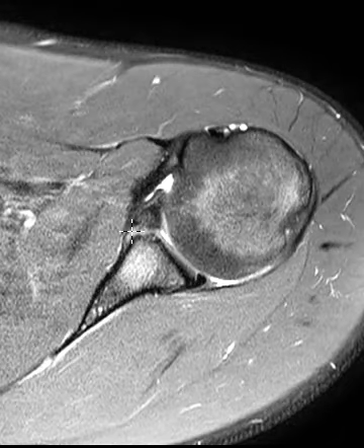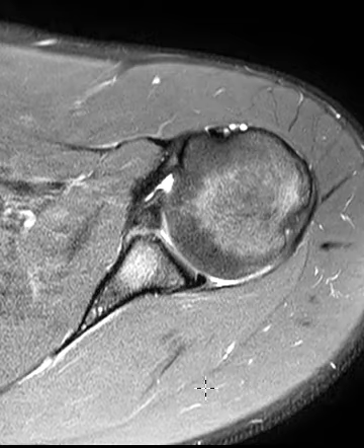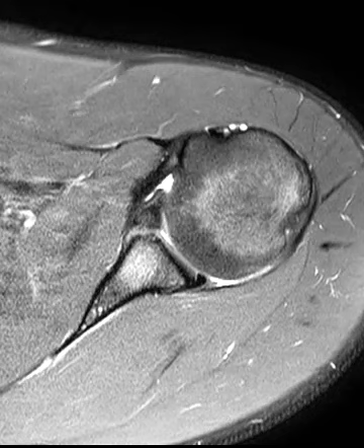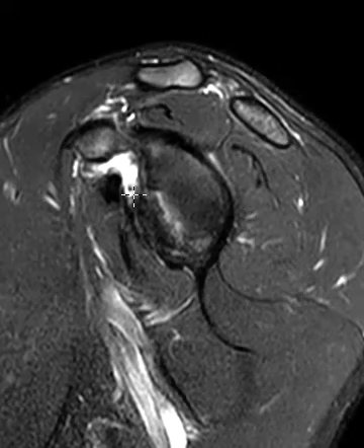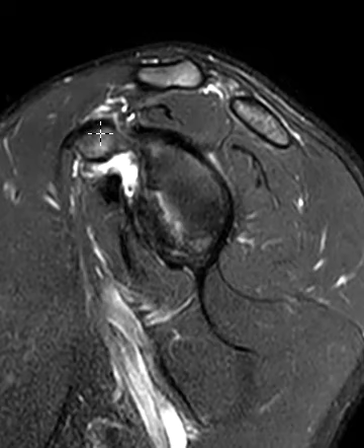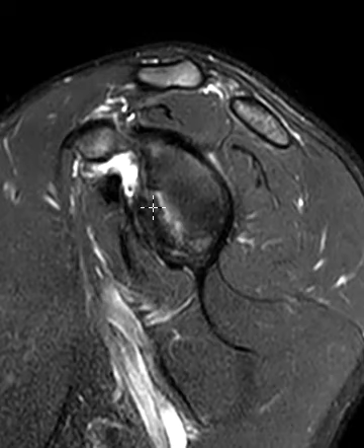And the main findings are the size of the bone lesion. If it's more than 25% of the AP dimension of the glenoid, it may have surgical implications. So I usually mention the size in the AP dimension and also the vertical dimension. We can see the vertical dimension better on a sagittal image like this. From here down to here, here's the front, here's the back, the coracoid process, you can tell where the front is. And again, the fracture goes from here down to here.